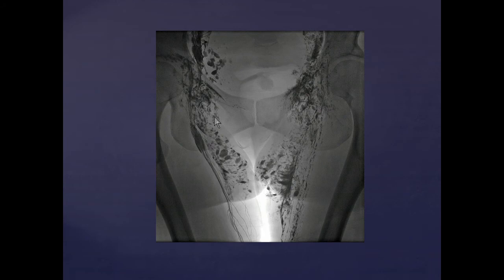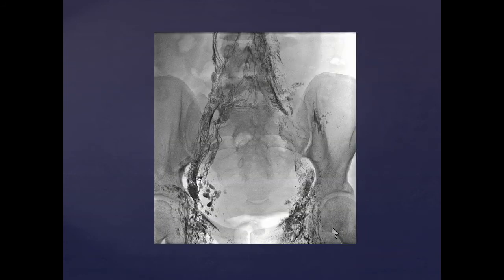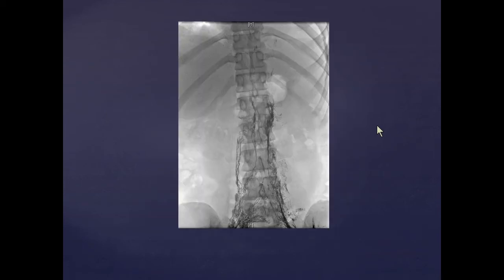You see all these lymphatic cysts, and everything's obviously in communication, but I don't really know how the connections are all made here. And this bizarre architecture continues up. You see these little satellites of funny-looking vessels. You know, they're following the iliacs. They're kind of in the right area, but they're extremely numerous, far more than you usually see.